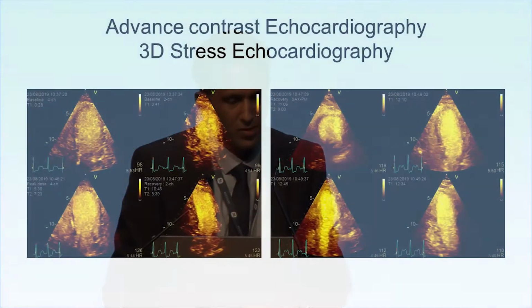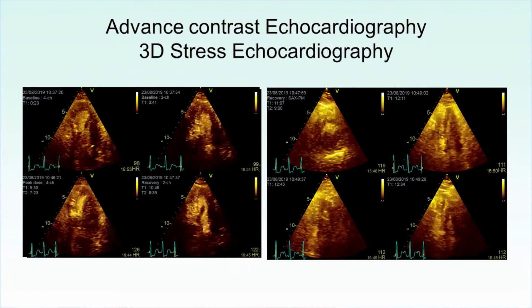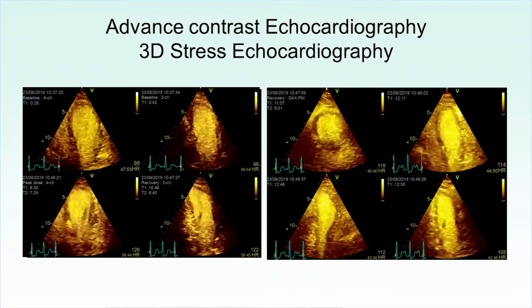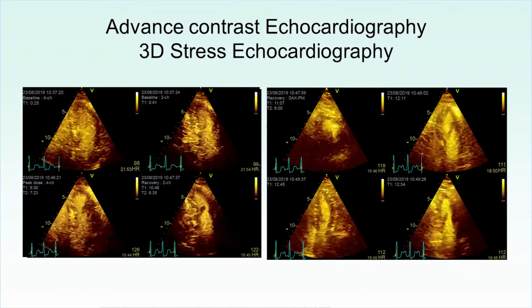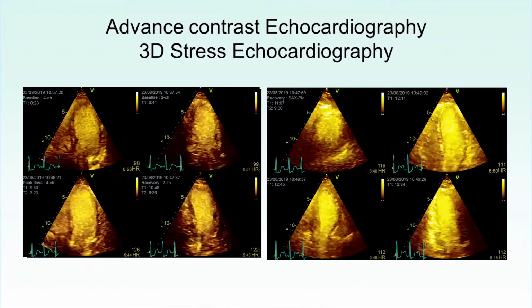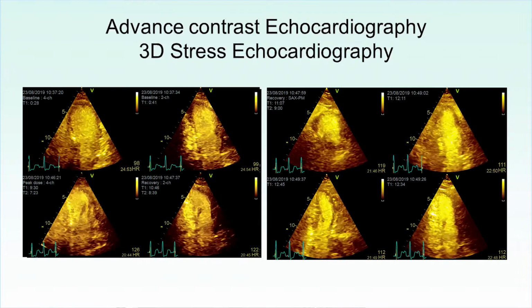So this is some of the advancement of 3D echocardiography. What you're seeing is two-dimensional imaging of stress echo. If you look very carefully, you can see a 4-chamber demonstrated there. But when you look at this 4-chamber, the apical region is slightly demonstrating a defect. Now, 3D plays an important role. Certainly, I endorse it as much as possible. And how do I do that?